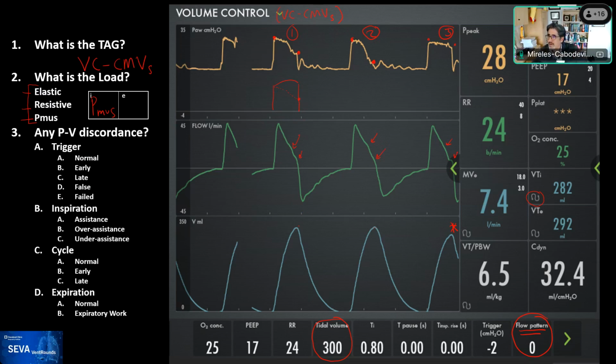So when you say normal, I presume that you refer to elastic, and it's the time, and you can see it's coming back to baseline from here. It fell in 1 second, all the way to here in more than 1.5 seconds. So this is consistent with elastic load. Perfect.